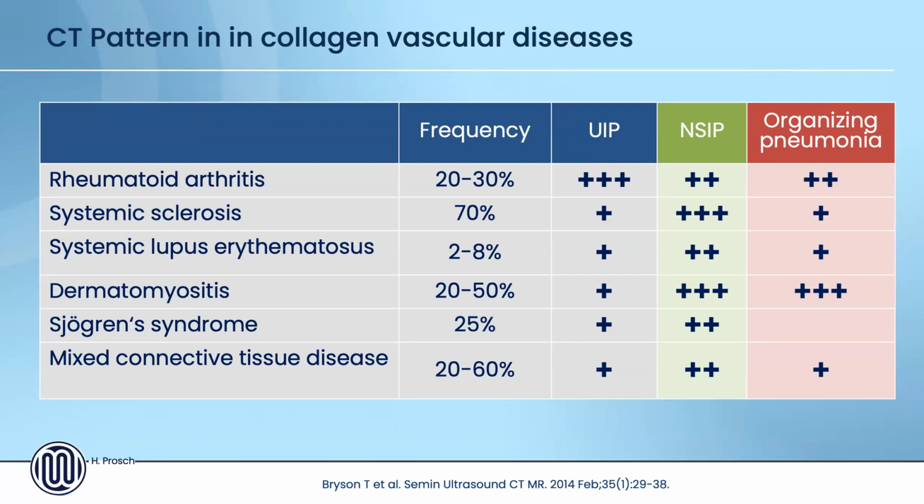Can honeycombing occur in fibrotic NSIP is a question which was raised by a colleague, and the answer is yes, you may see that. Usually we see the honeycombing there not at presentation, but during the course of the disease, and it's not as extensive as in the UIP pattern, but you may see that. And in some cases, in patients with a more advanced fibrotic NSIP, it then may also look like a UIP pattern. That's absolutely right.